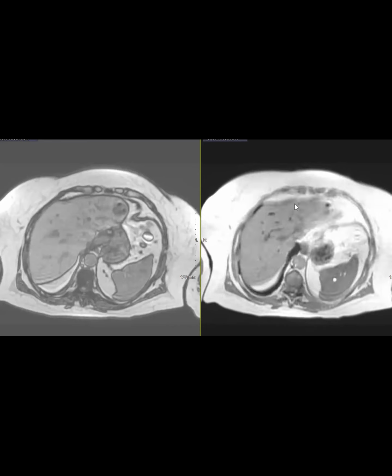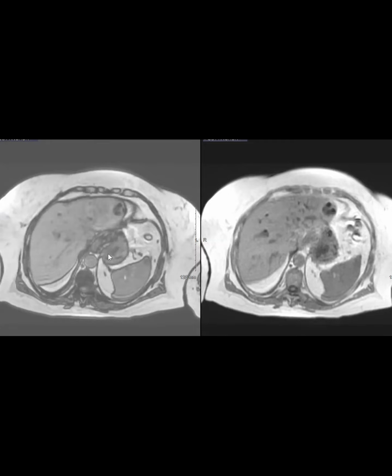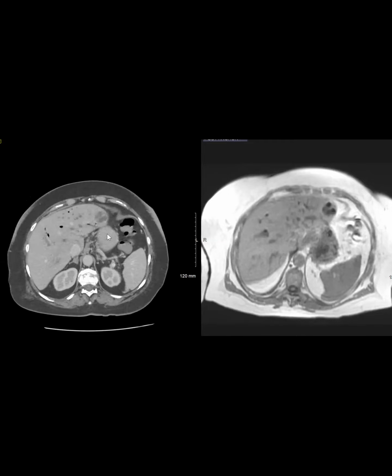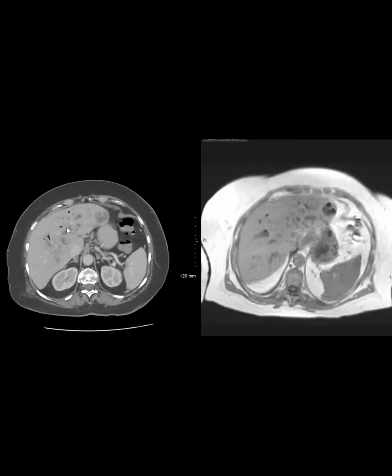And like it's like a biloma. No, it wasn't. It's an abscess. No, you shouldn't. Victoria, on the very first one, did it look almost expansile? I was thinking, is it some sort of a TIV-like thing? Because it looked like there was soft tissue.